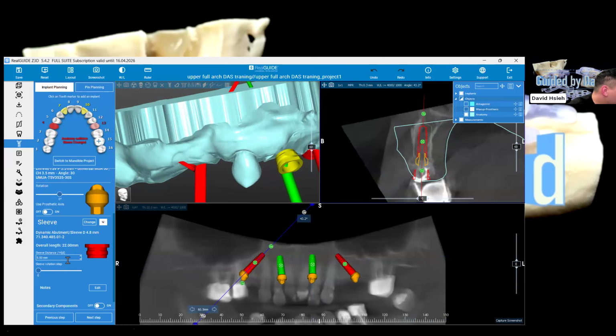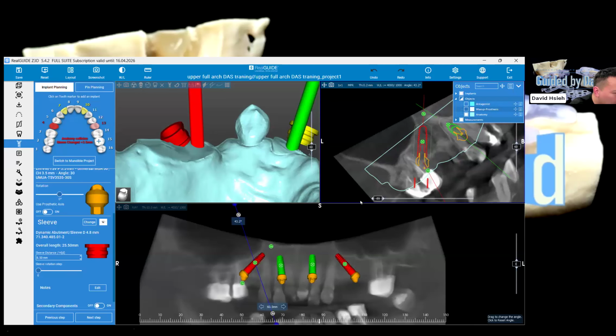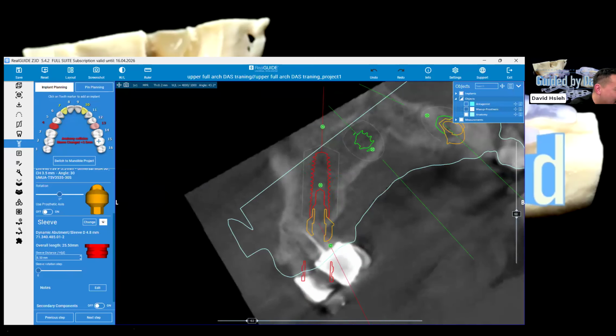So let's see this guy. Let's keep raising it. This is so beautiful. I love this. So this is a 9. This is a 9.5. Let's put it back a little bit. We can keep increasing it. Oh, yeah, we do have to. So let me see the depth of the implant. All right. So this is the back example, right?